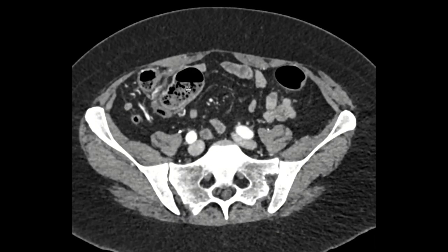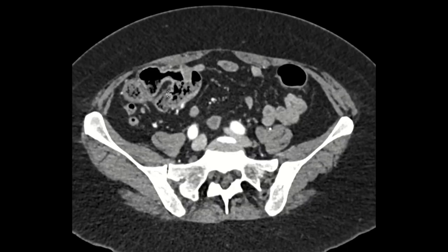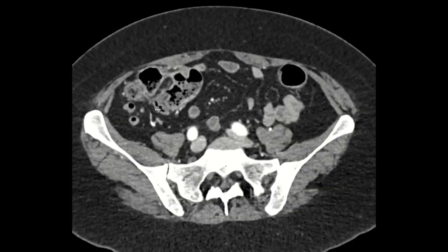Usually your ileocecal valve is on the medial aspect. In this particular patient, it is in the lateral aspect. The cecum can flip around and be in any orientation. And so I think finding the ileocecal valve is an important first step in identifying the appendix. So then the appendix is always going to arise from the cecum lower than the ileocecal valve, but on the same side as where the ileocecal valve comes in.